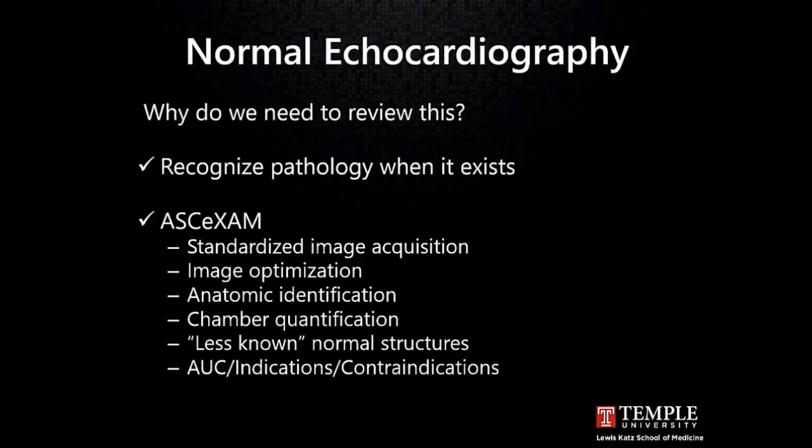So the normal echocardiogram, why do we need to review this? Why did we start with this? Really, the overwhelming reason is that we need to recognize pathology when it exists. And if you are interpreting normal structures as pathologic, then you're not doing any service to your patients.